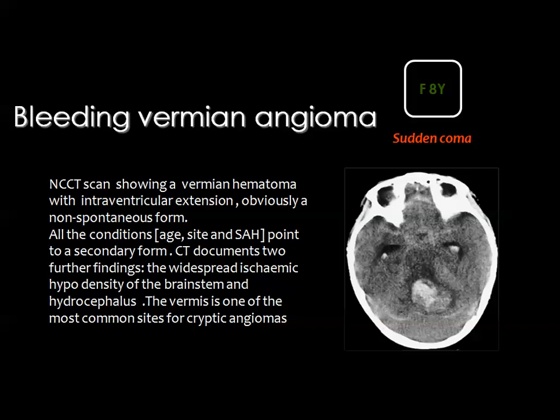Number one, whenever you see bleeding which is not related to trauma in the pediatric age group, then you think of an underlying pathology. The pathology underlying the hematoma is usually one of two: either the cavernous hemangioma or the venous angioma, or an arteriovenous malformation. It is easy to appreciate the hemorrhage by CT, and this is the usual way of investigation in emergency.